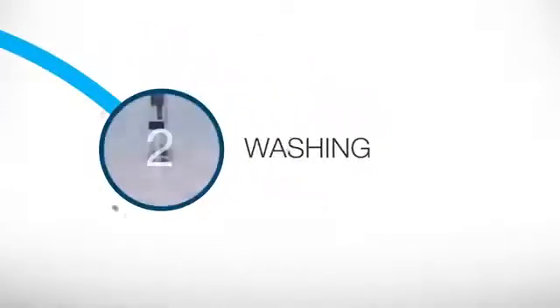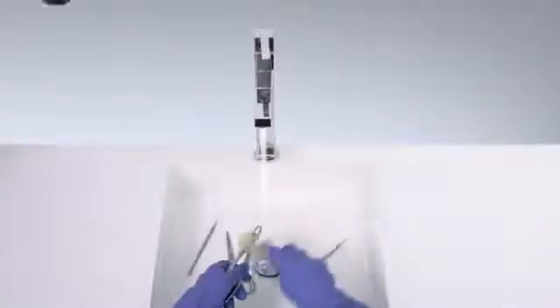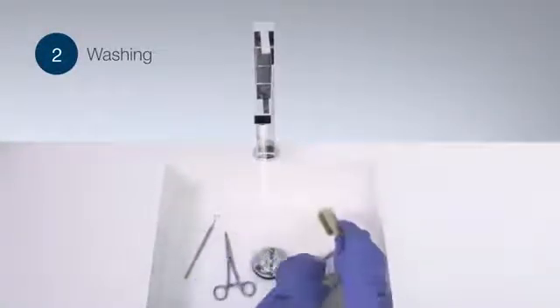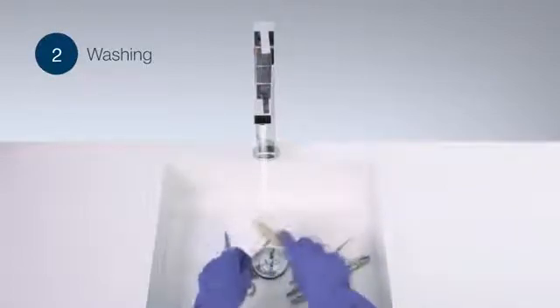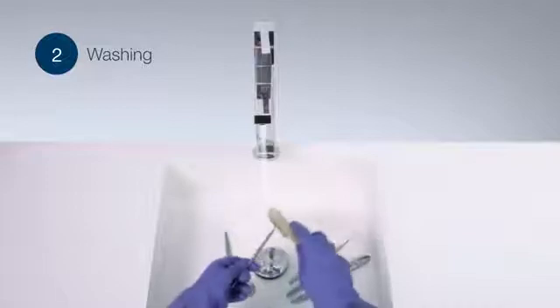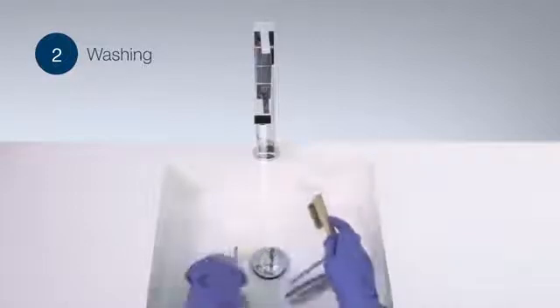The importance of washing is to ensure all instruments to be sterilized subsequently are clean. This means deprived of all organic or inorganic residue. Washing in the standard process is manual. It involves a certain degree of risk.